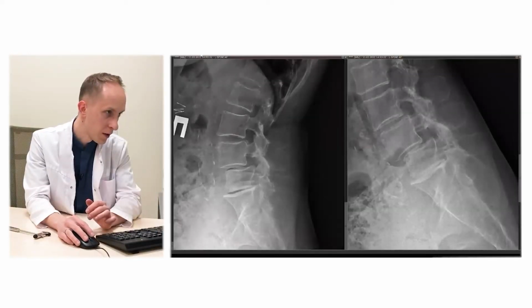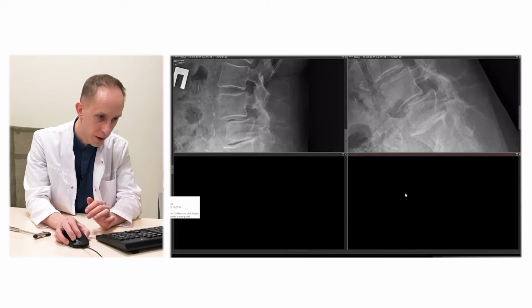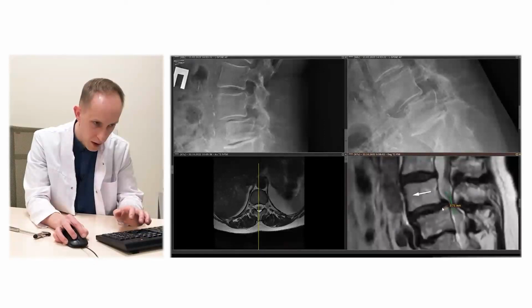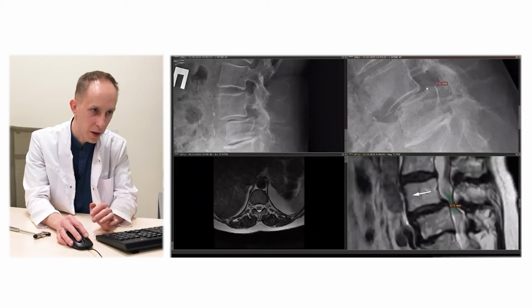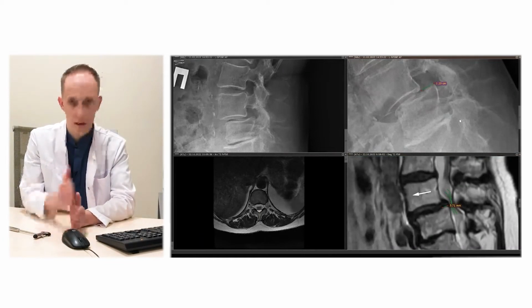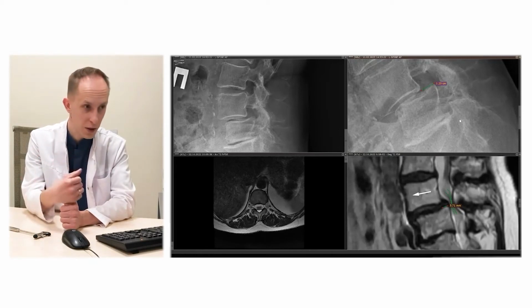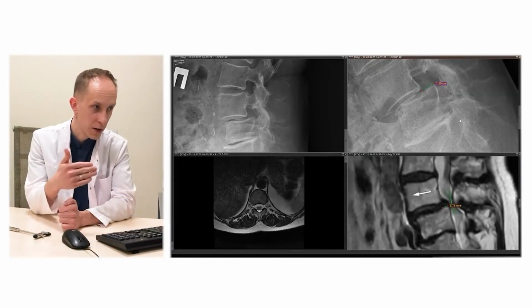Compare here, where she was lying in the MRI, right? You see, if you measure the distance here, it's about 5 or 6 millimeters, but here, look, the patient bends, if you measure the distance, it's at least twice as big. That is, when the body position changes, when the patient lies on the MRI, her displacement is minimal, when she stands up, the displacement progresses significantly. That's when she extends in a standing position, and when she bends, it increases even more.